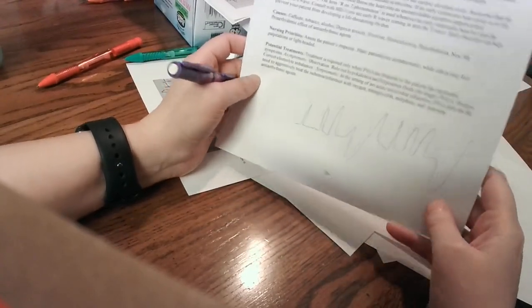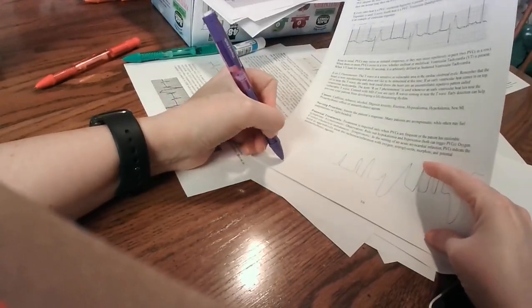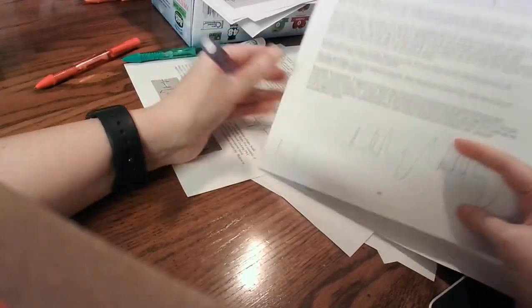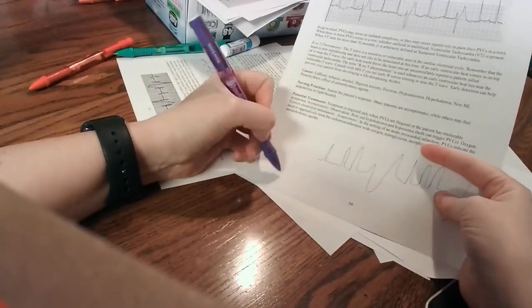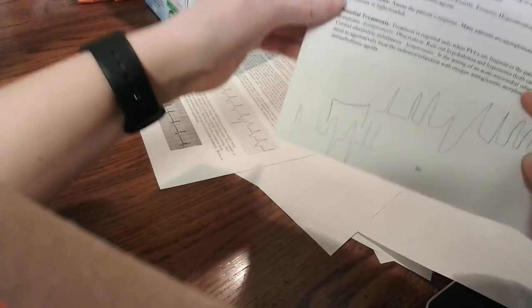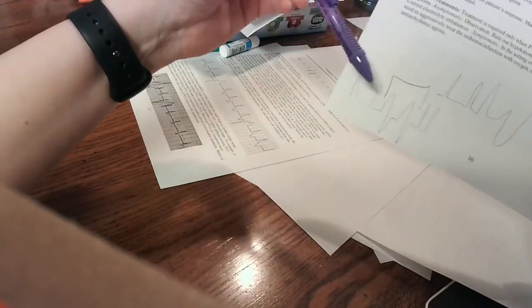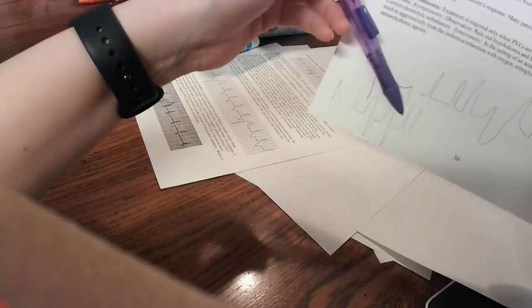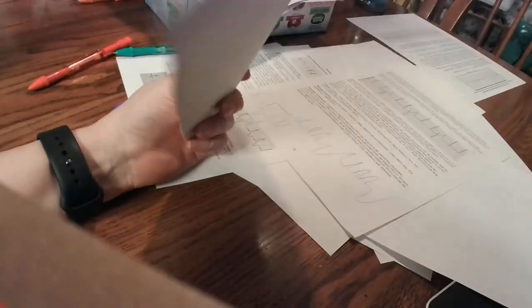And there's another thing that's called couplets, and that is when you're having normal beats. They should be much thinner than that, I'm making them far too wide. But then you have 2 PVCs in a row, and then normal beats. So that's what we call the couplet, whenever you've got a regular pattern: normal beats and then two together, and then normal beats, two together. Anywho, I'm going to do the last ones in a different video because this one was kind of long.